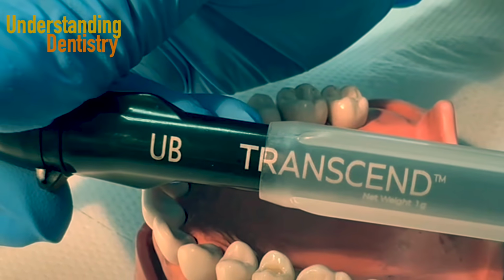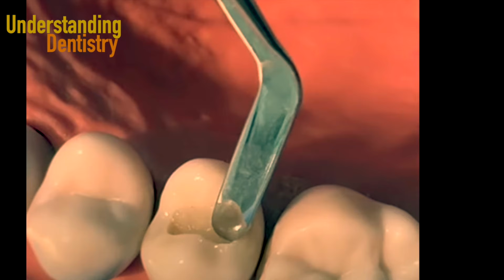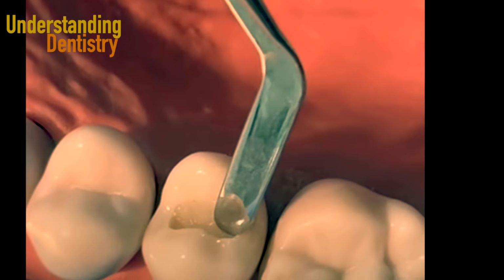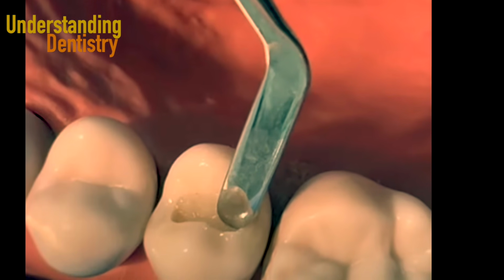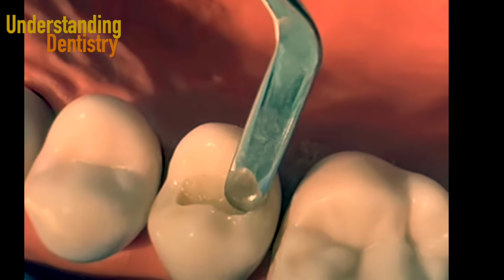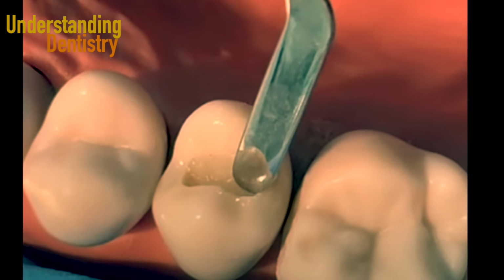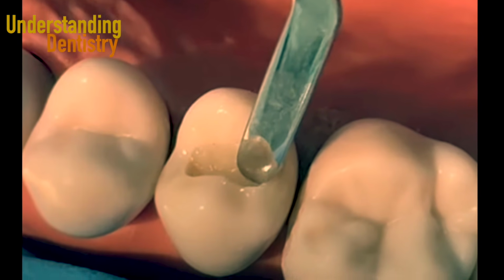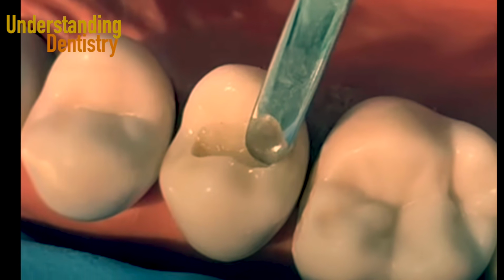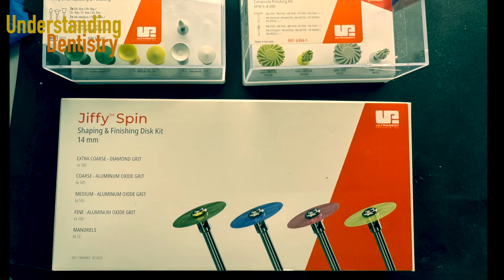Then you are going to proceed with the composite restoration, so you are going to choose a composite resin material to do your restoration, and then you need a plastic instrument like this one. So this is usually the name. You need an instrument to insert the resin in the cavity, okay? Just like this. I will also add the link of the video showing this procedure on the top right corner of this screen. It will show up at some point. So you can choose different shapes of plastic instruments, for you to be able to follow the shapes of the cusps and the tooth anatomy for your restorations, okay?